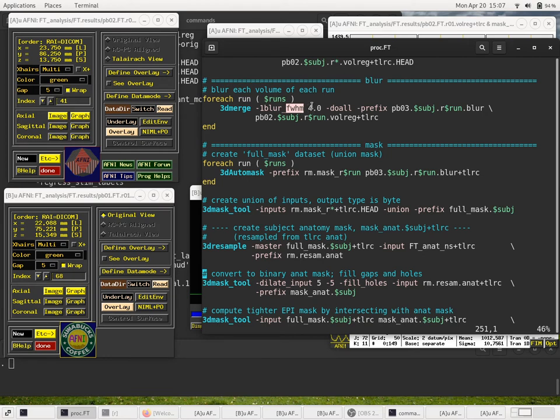And that means at a 2 millimeter radius, you get half the contribution that the central voxel contributes to the output result. So the result at one voxel will get 1 times the current voxel plus half of the first neighbors, etc.